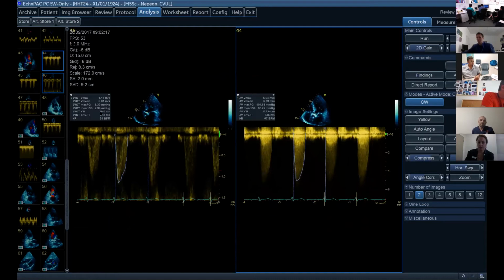Yeah, so here I'd be comparing 29. The LVOT is 29. And if we didn't have LVOT obstruction, mid-ventricular obstruction, I could use that VTI as well. So 127. How do you do the calculation, and what's a marker of severe? I'm not sure. Is it 0.25? Yeah. You can't use it in this case because of the mid-ventricular obstruction. But if we didn't have that, you could just compare those two, divide 29 by 127, and if it's less than 0.25, that's a marker of severe.